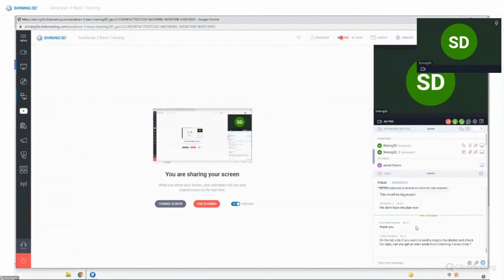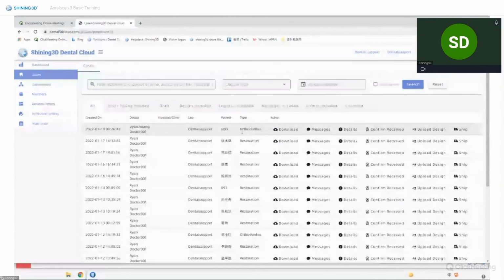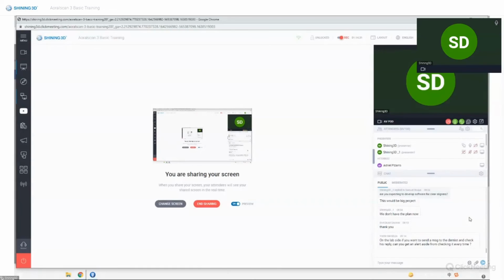Okay, do you have any questions? I'm not sure if you can get alerts aside from checking it. On the left, if you want, you can send messages like this to the doctors, but I'm not sure if the doctors will get alerted for this message.